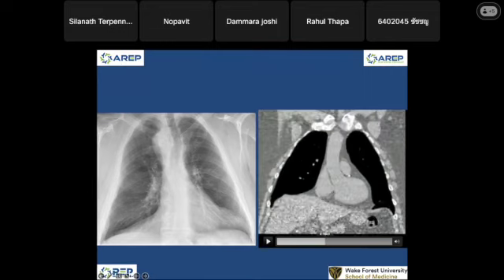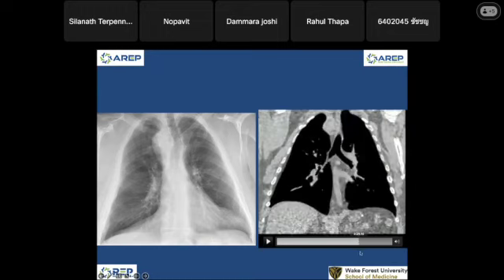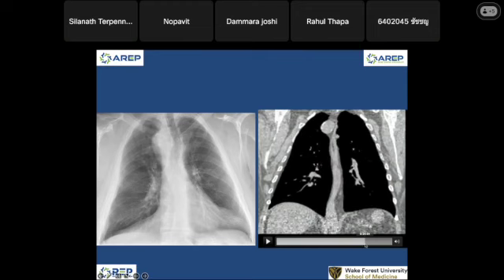What structure is that? Esophagus. The esophagus is right here. Thyroid tumor, I guess. This one is the aortic arch. The patient has a right-sided aortic arch and has a lot of atherosclerotic disease. So it is losing elasticity and it's really hard. So the trachea is pushed to the left. See that? This is the mediastinal mass that turned out to be a right-sided arch.